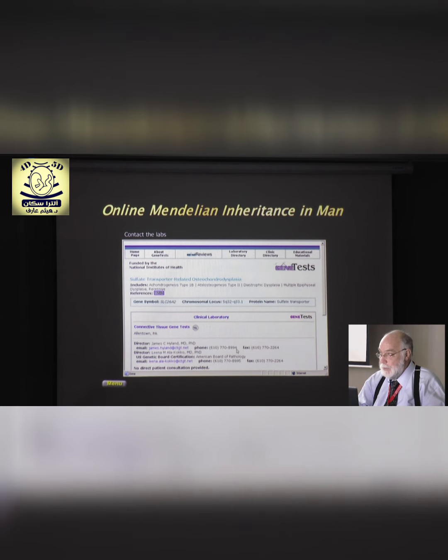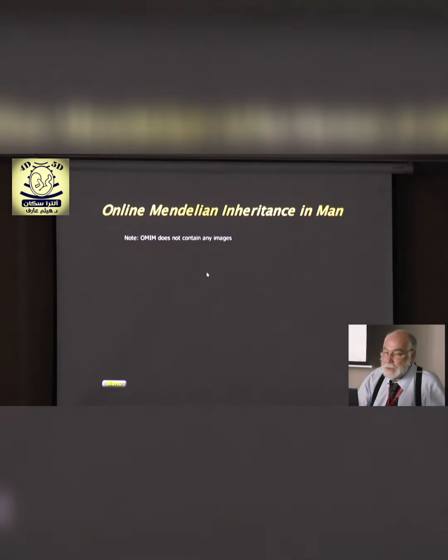So when you're scanning a baby that has something unusual, you can ask, what kind of fluid do I have to give this person? Amniotic fluid, whatever, and how many cc, and how long does it take to get the test, how much does it cost, so you can get some very important diagnoses this way.